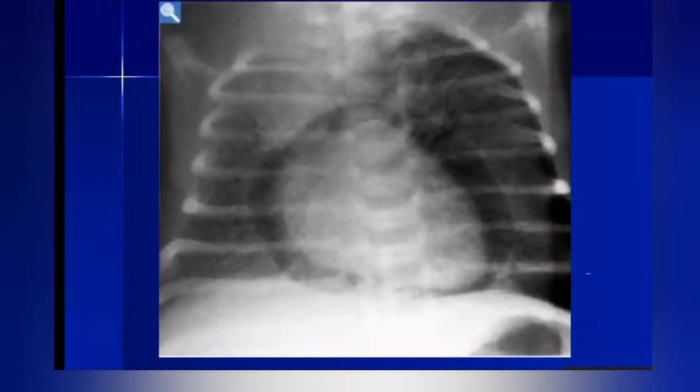Yes, sir. So I am provided with a frontal chest X-ray of a skeletally immature patient, and I can appreciate that there is a well-defined lucency within the mediastinum. It is surrounding the heart, and a part of it is going into the neck. And relatively, there is decreased aeration of the lungs noted.